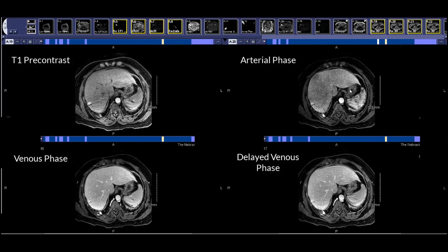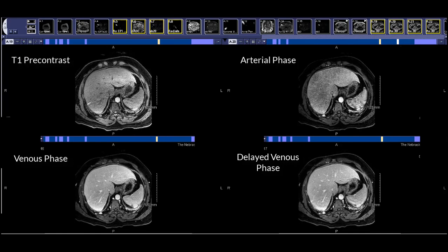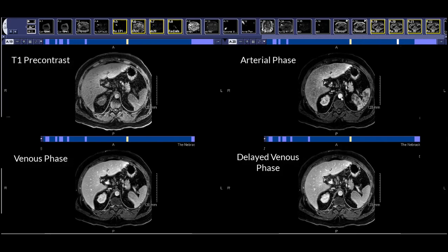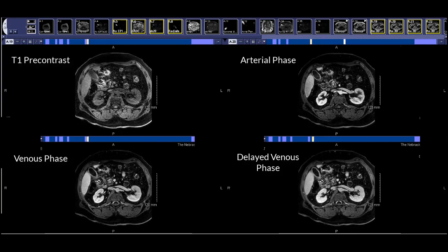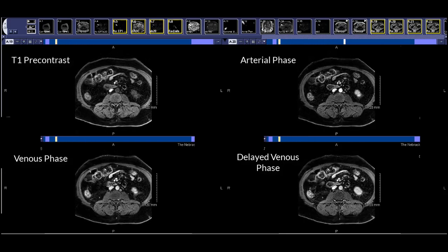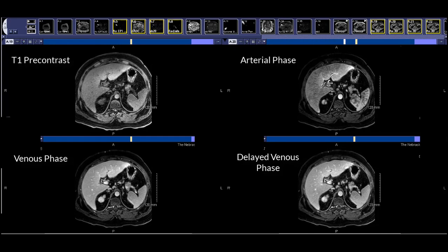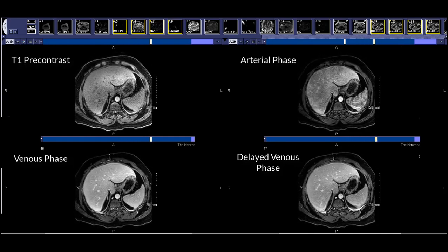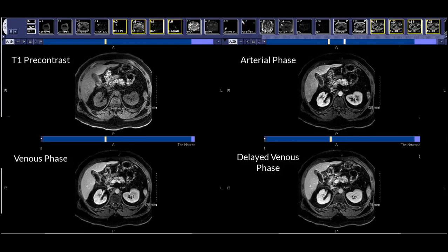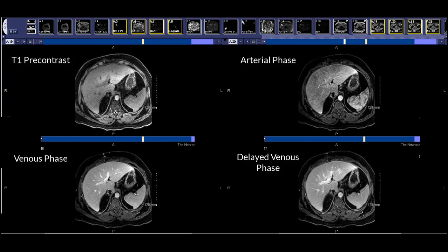Another search pattern checklist item for the post-contrast is to look at our vessels. So the abdominal aorta, its branches, the celiac, superior mesenteric, bilateral renal arteries, and inferior mesenteric arteries. Make sure all those are patent. We try to look specifically at hepatic arterial anatomy a lot of times to see if there is any variant anatomy that we should bring to the clinician's attention.